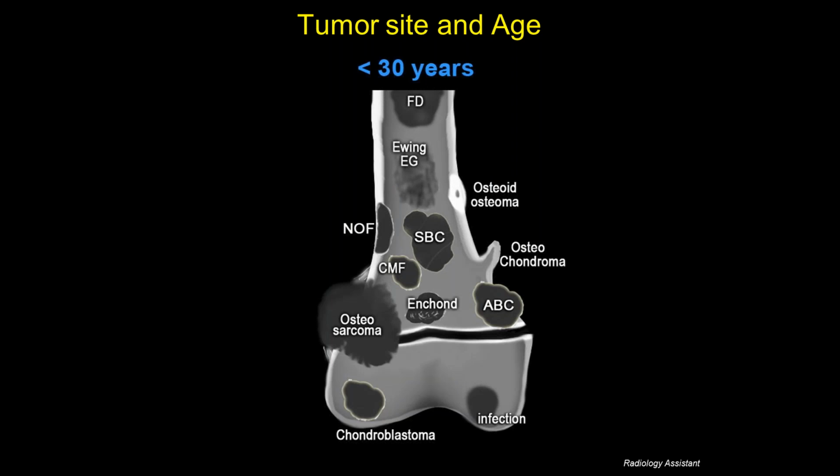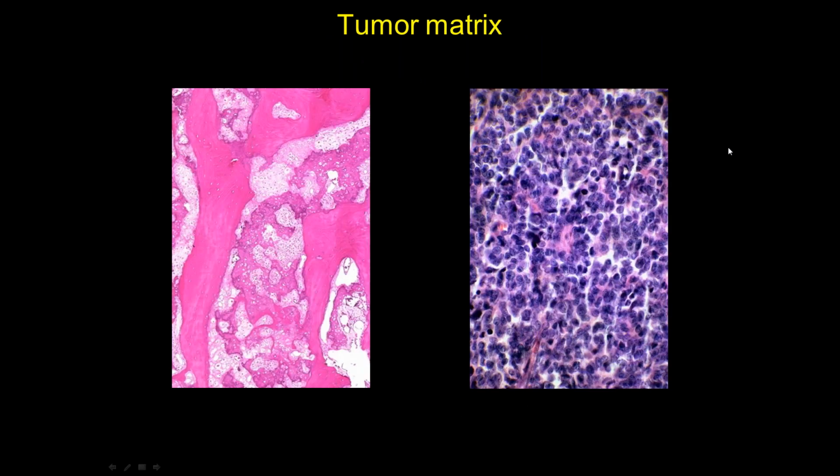And so the ones that we will see most and that are malignant are the Ewing sarcoma and osteosarcoma. And it's quite important to try to differentiate both of them. What is really important is when we look at both of these images that we can see here, I'll give the people watching the slide 10 seconds in order to decide for themselves which one is the osteosarcoma and which one is the Ewing sarcoma. So I hope you just made up your mind, and let's go through these images together.